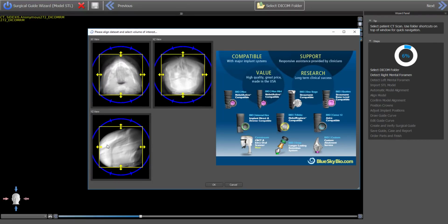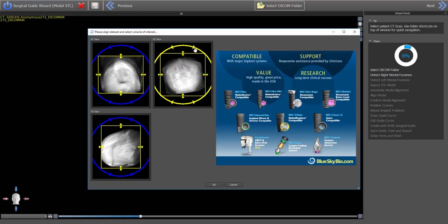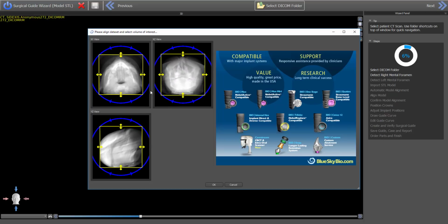Not to mention, there's nothing in the base of the skull that alters my treatment plan of a number 19 implant. So let's eliminate most of that data so that it doesn't bog the computer down and it's not obscuring our view of other things because of such a large model. When you do this, the first thing you should always do is to parallel the occlusal plane to the floor. If there was a cant, you can grab the blue ring and parallel that to the floor.